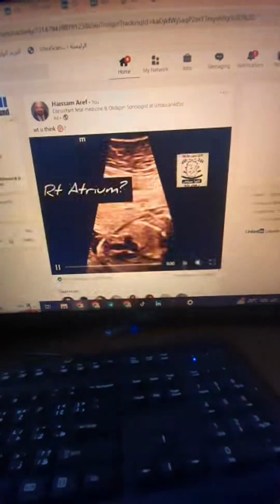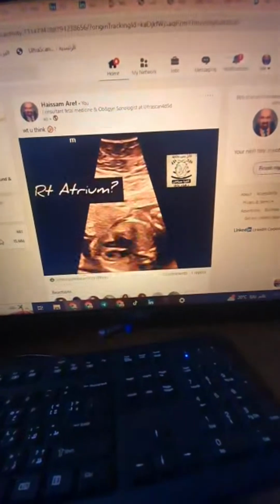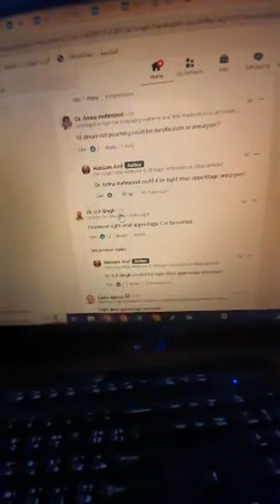Our third case for this week was a case of right atrial appendage aneurysm. We had comments from many of our friends, but the comment came from our fetal echo expert, Dr. UP Singh. He says prominent right atrial appendage can be normal, but it's not normal here. It's abnormal. It's a right atrial appendage aneurysm.